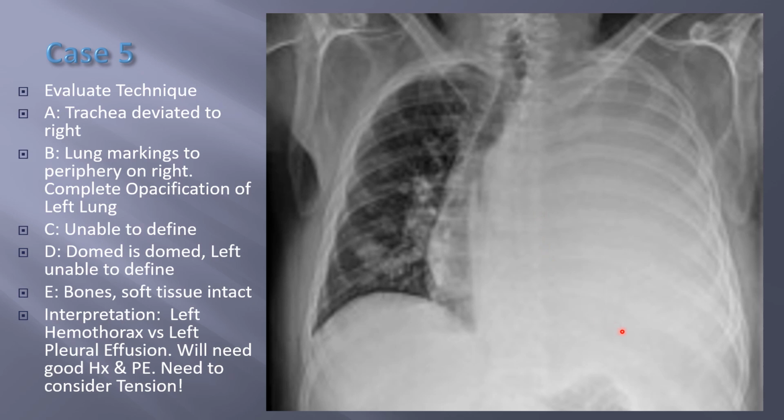Plus, if this patient is hemodynamically unstable with this much fluid in his chest, meaning that it is now pressing on the heart and not generating a good cardiac output, such as blood pressure and things like that, you need to relieve some of this fluid to take that pressure off the heart. And plus, this might be uncomfortable for the patient breathing wise, might be very short of breath and things like that. So if you start draining some fluid off, start getting this lung inflated, the patient might feel more comfortable, and then the heart will function better.